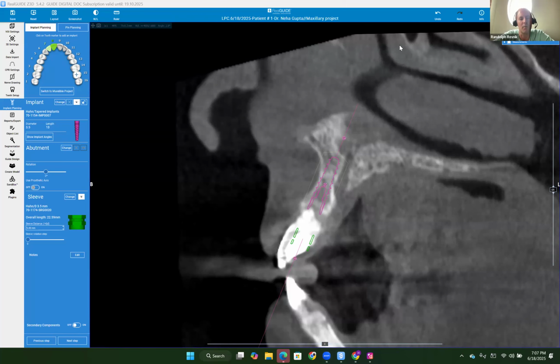It's just going to be too difficult to try to grow bone when placing the implant there because you're going to have fenestrations, and it's going to be very difficult to get to there. So for this case, I would do delayed placement, take the teeth out, do a GBR where that concavity is at 7 and 8, and then come back in 4, 6 months, and you'll be able to get two good implants in there with abundant bone there.